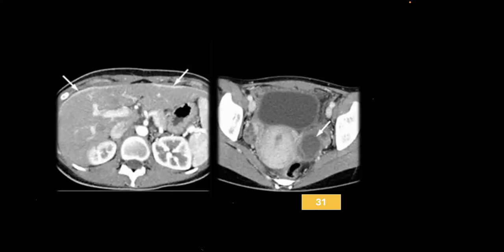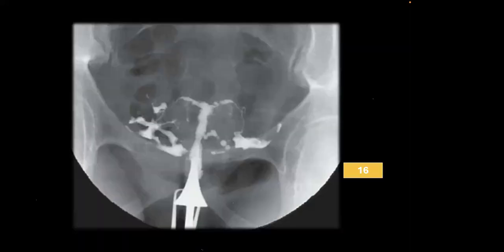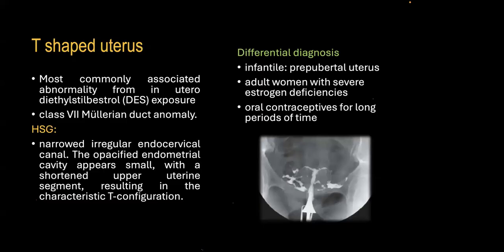Akshay, great. Right? Okay, so we'll come to the answers. What do you think this was? I think few of you have got it correct, because does it look like a T-shaped uterus?